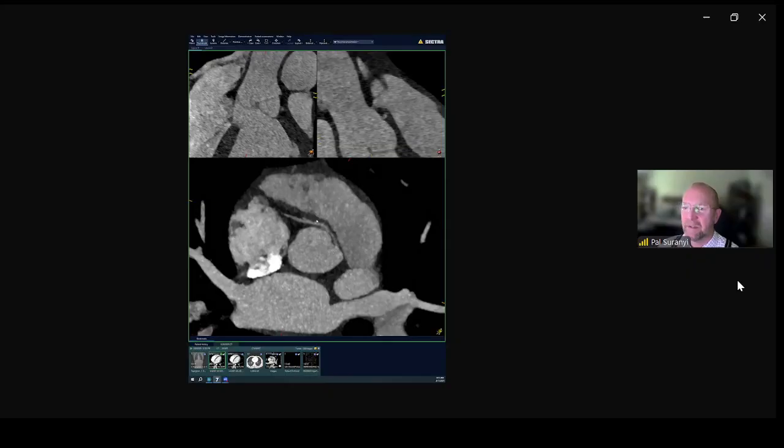We just describe that it's interarterial, and when a coronary anomaly is interarterial, it can lead to significant reduction of blood flow in that coronary artery during exercise, when the cardiac output increases in both great vessels, and maybe their orientation might even change a little bit, and there could be a kinking phenomenon and a compression phenomenon that would lead to reduced flow in this right coronary artery.